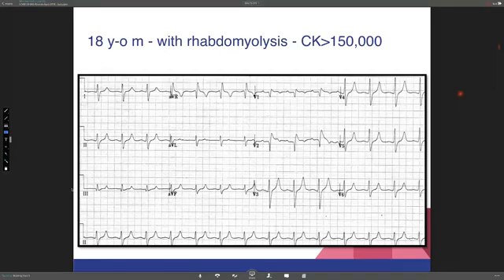I'll give the audience 20 seconds or so to look at this. The patient was asymptomatic. He did not have any chest pain, but he looked ill. Cardiology was called because of possible ST segment elevation, which, let's see if I can get my mouse. There was a comment about ST segment elevation in these two leads. There was some concern because the machine called this an MI, but the patient was asymptomatic, but the CK was high, etc. So this was the EKG.